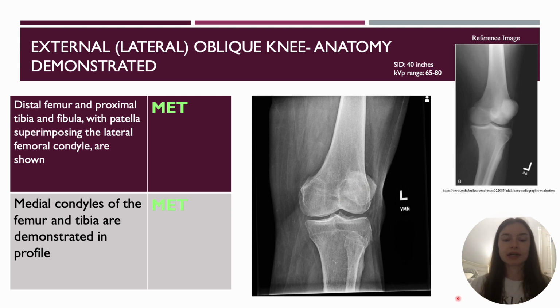The next criteria is medial condyles of the femur and tibia are demonstrated in profile. So I also said met for this one because that femoral condyle and the tibial condyle is in profile right here.